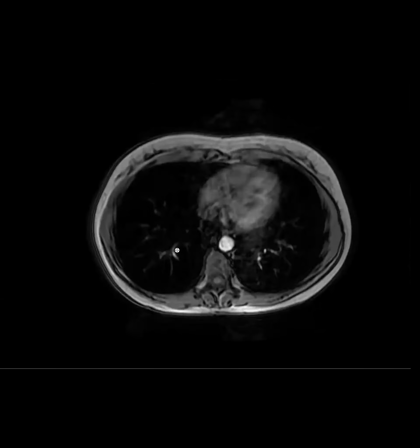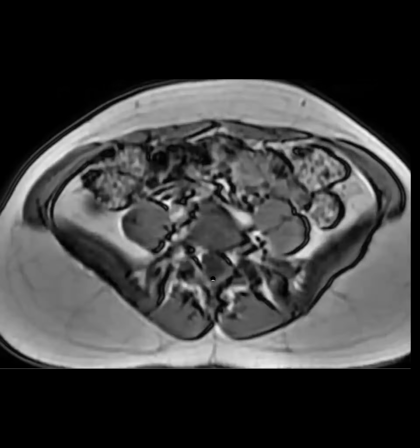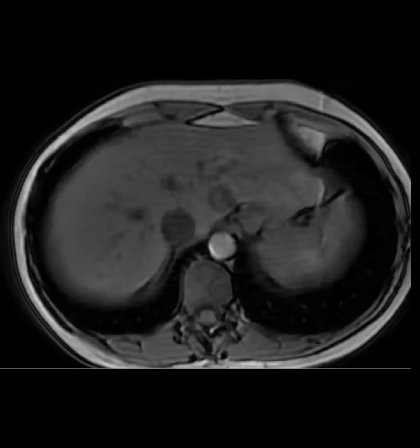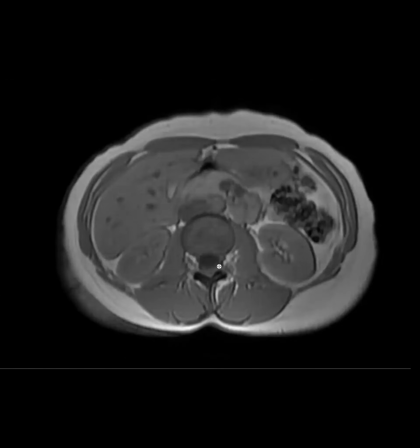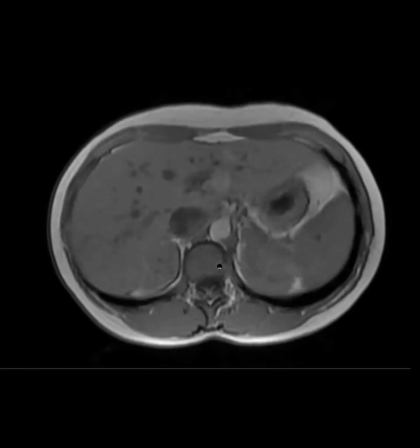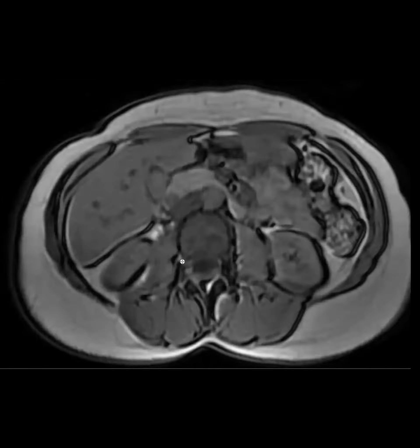Do they have intracytoplasmic fat? That's a great question. I don't think so. Any risk factors for adenomas? Not that we know of. But it looked like the background liver is fatty. So, for example, that slight washout might have been because the background liver was fatty, but it still could be FNH.